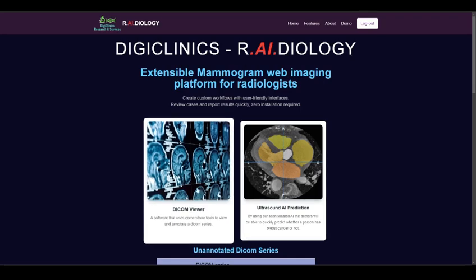Our DICOM viewer works like this. So what's a DICOM viewer? A DICOM viewer is a tool that we provide that basically lets you view a DICOM series and also perform annotations on each and every DICOM image present in it. So what's a DICOM series? A DICOM series is basically multiple DICOM images that are taken during a specific scan, and they're ordered in the sequence in which they are taken.